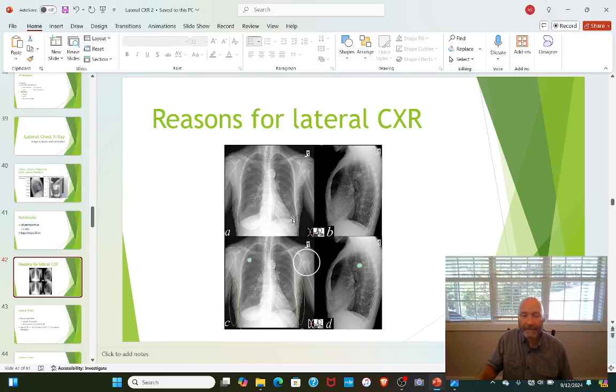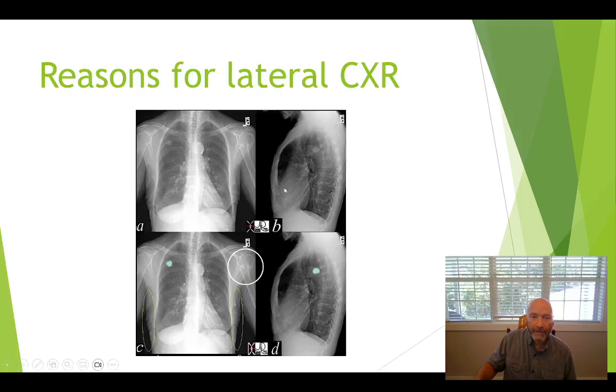So we've got this image here, and they conveniently colored this particular lesion. What we see here is the raw X-ray. As I mentioned in the previous video, cancers look very subtle. So this very well may be a cancer, and we can't identify exactly where this lesion is. It looks like it's an upper lobe, and it probably is an upper lobe just off the PA.